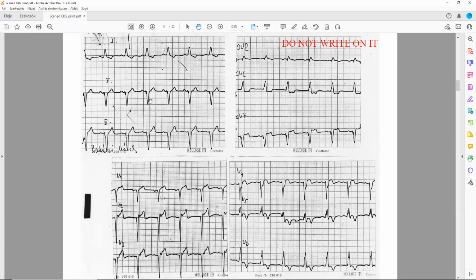What does it mean? It can be delayed conduction inside the ventricle, so we do have an intraventricular conduction abnormality. We could have a right bundle branch block or a left bundle branch block. So, what do you think? Which one is this? I think it's left, because you do see the wide R wave in V6 or lead number 1 or aVL. Good, very good.